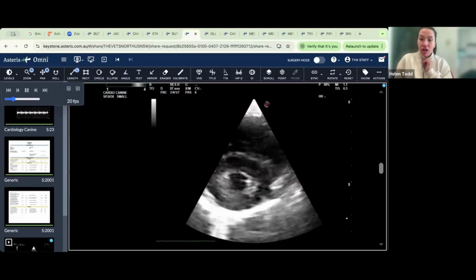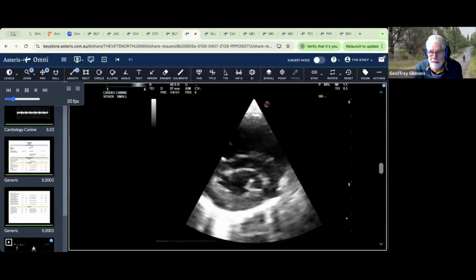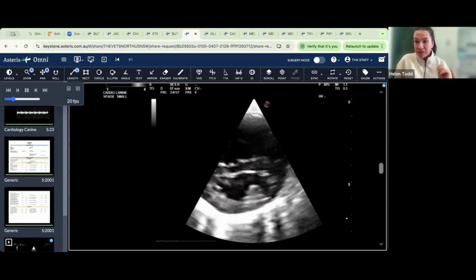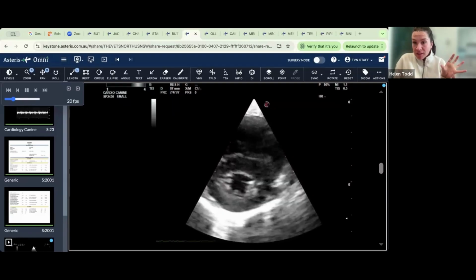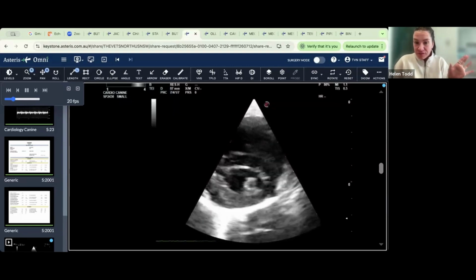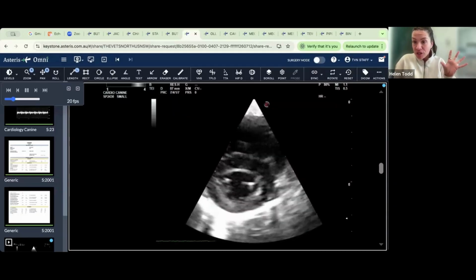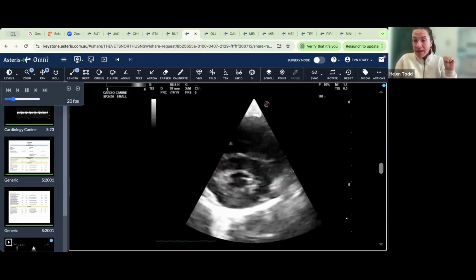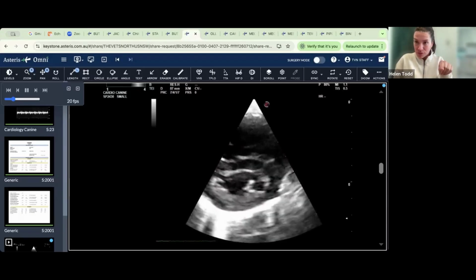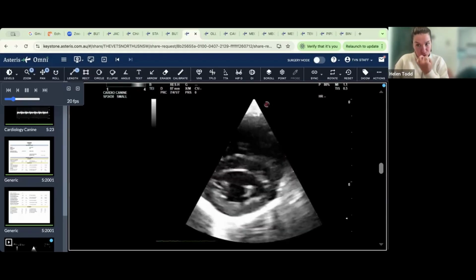Pulmonary valve constriction. Yeah, perfect. Pulmonic stenosis for sure. So if that right side of the heart, you definitely can get flattening with right-sided failure for sure and profound volume overload, but often it's with the pressure overload. So if you think that right side of the heart is pumping against the lungs and the pulmonic valve, if we see this, we really want to interrogate both for pulmonary hypertension and pulmonic stenosis for sure.